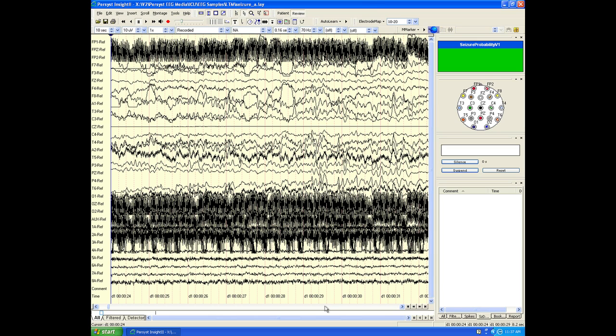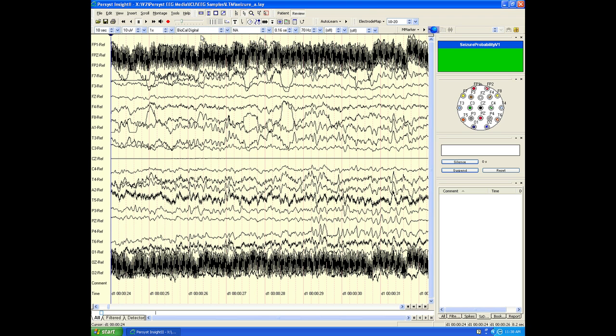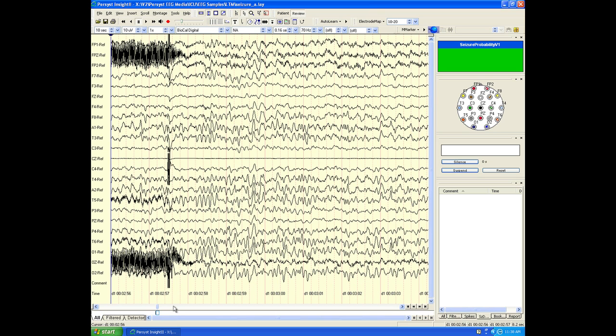While many EEGers view the EEG in a double banana or bipolar montage, at the start of a recording, it is helpful to check the EEG signal using an amplifier reference montage. The reason is that bipolar montages subtract the reference from each channel, and the amplifier reference is actually common to all channels. Therefore, we'll want to check for bad channels or a contaminated reference when viewing the EEG in an amplifier reference montage with the notch filter off.